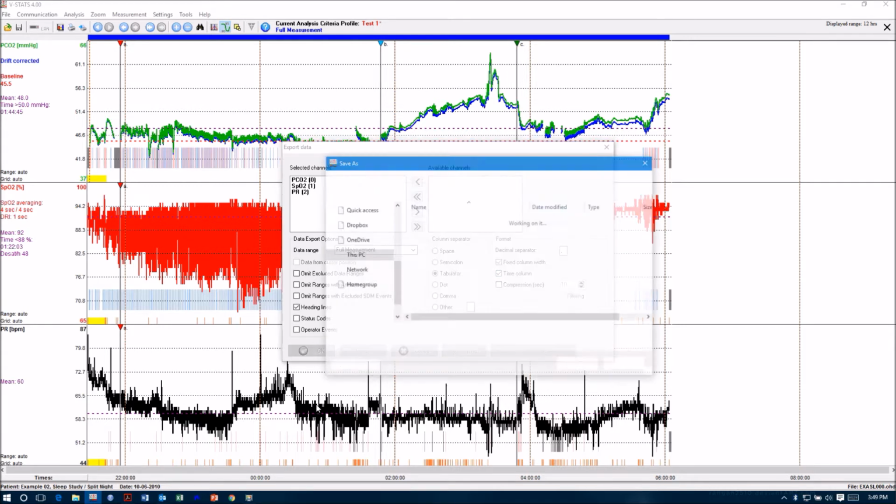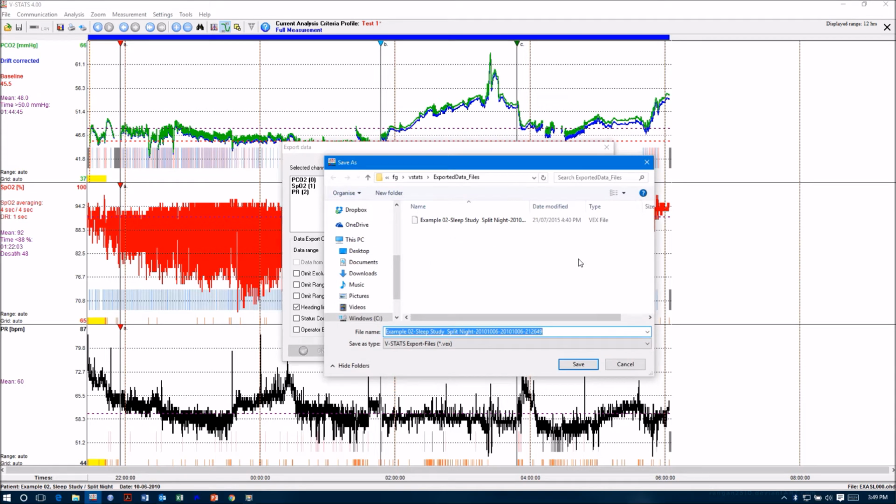So OK, and if you've done this for the first time, it'll actually give you a warning before this step that tells you that there is going to be patient information in this export. So be careful with who you share it with. But I've just gone, no, I don't want to see that box again, so it's taken me straight through to the save box.